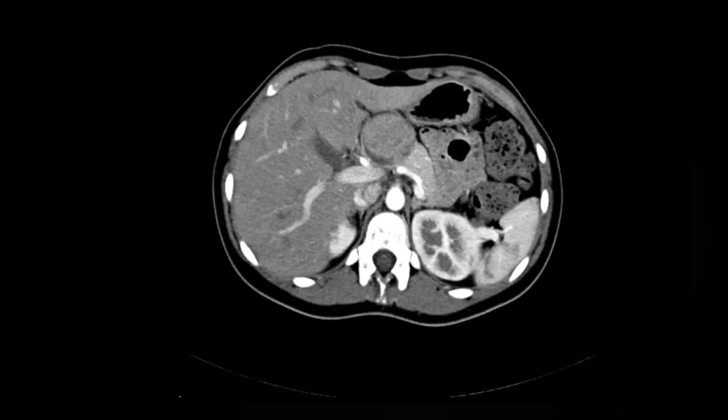So in summary, I would like to see its pre-contrast image also, whether it is having some calcification in it or not. If there are calcifications, mucinous or serous. Yes, sir. No calcifications. So I will describe it for you simply.